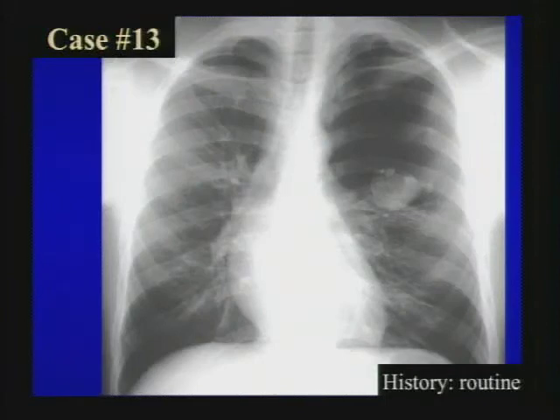And I think maybe 2 more. Routine. This patient was asymptomatic. So it's a very typical constellation of findings. And then the question is, what is causing it? And what should you do to evaluate it further, if anything?